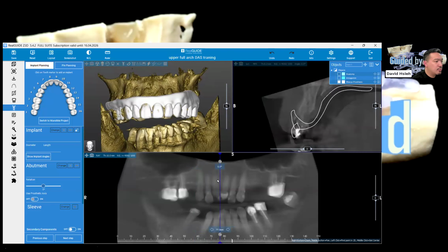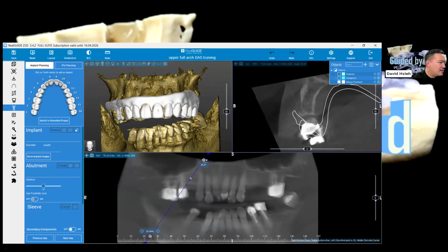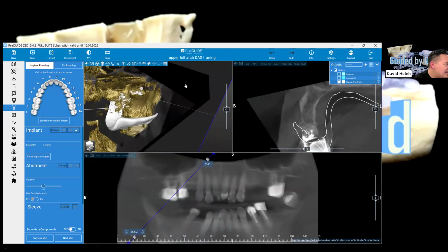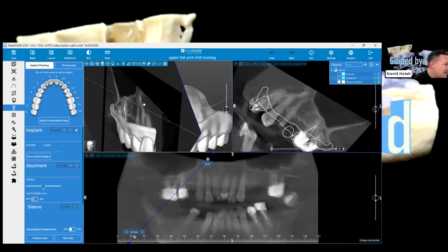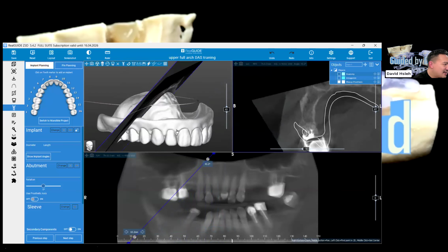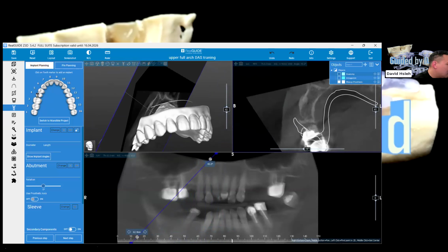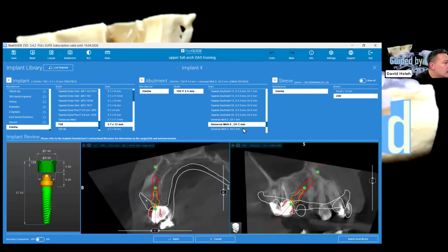So the next thing is to place the implant, right? So we try to do a class 3 implant. So I'll do a tilted planning here. As you can see the angulation like that. Let's turn this off so you can see, right? So now we can try to place the implant there to avoid the sinus. And from this angle, because it's tilted, we will be allowing a good amount of bone to fit the implant. So let's try out that. All right. And then usually in this position, we will need a 30-degree angulation.